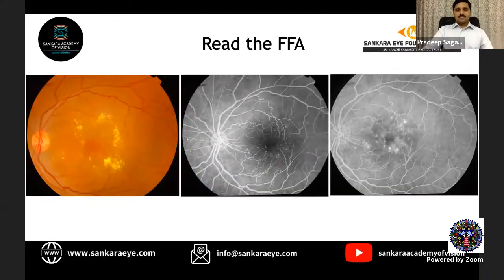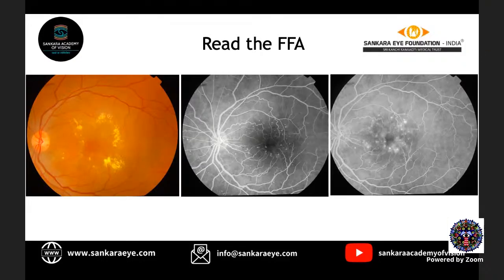Like in the last class, we discussed that if there are any students in the hot seat, they can read the fluorescein angiography images. Sony, would you like to do that? Yes, sir. Good evening, sir. Anybody, Sony, please read that. Yes, sir. Just put that on, Dr. Pradeep.